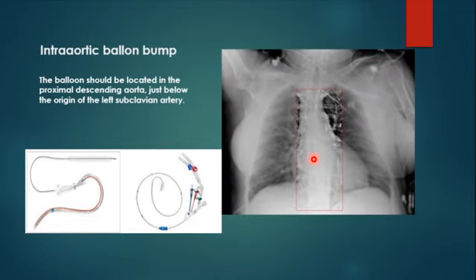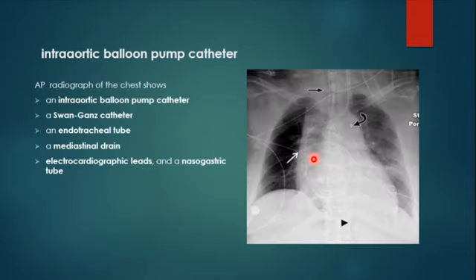Of course, just keep in mind, it will always be in the ICU. You will not see it in an outpatient. And it will always be on a portable X-ray. You don't see it in the normal, conventional X-ray. Always portable, always critical, always ICU. Yes, always, this balloon pump.